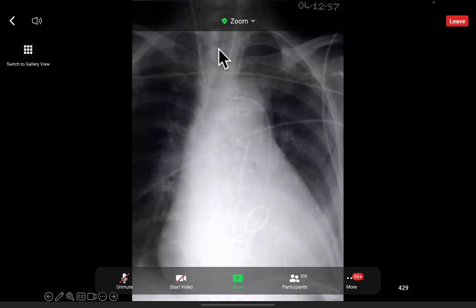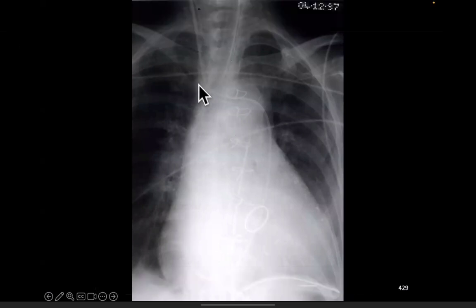And it's inconceivable that the patient has got a right-sided SVC, because why would two of those catheters preferentially go to the left when they would normally go to the right? So this is a solitary left SVC.